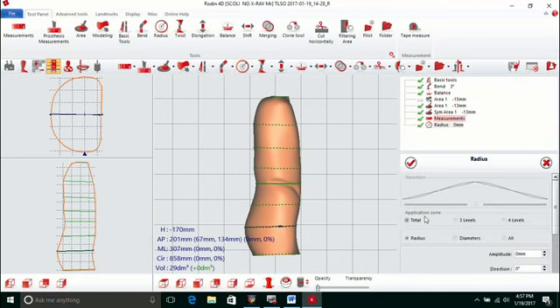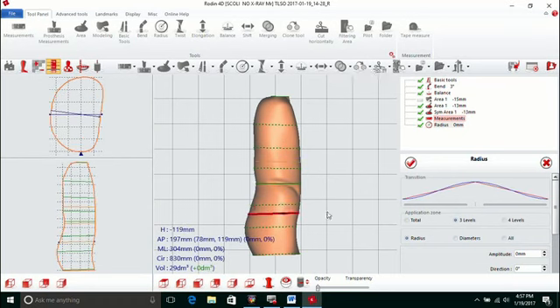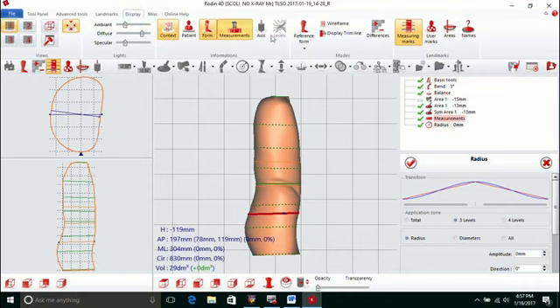Now, application zone. Similar to the other tools, you have your levels. I like to use 3 levels. The 4 does the same thing, it just adds a different level inside. I prefer the 3, but you can try either way. Alright, so we'll go 3 levels. Left click, left click, left click. Apply those on there. And if the model gets too busy with all the lines on here, what you can do is top menu line display, and you can turn on or off your measure marks.